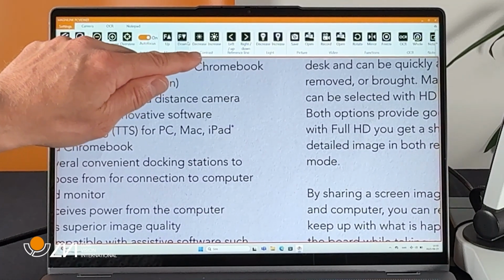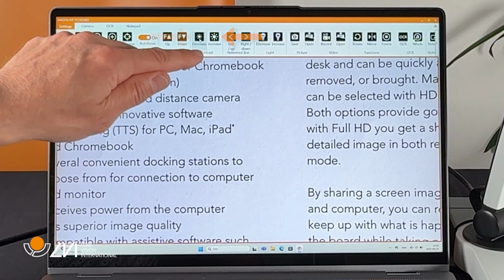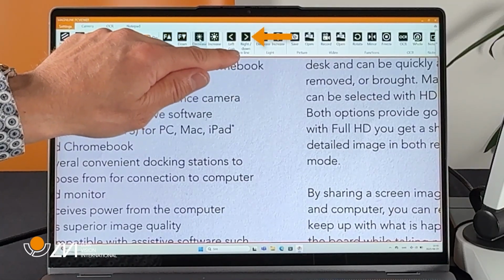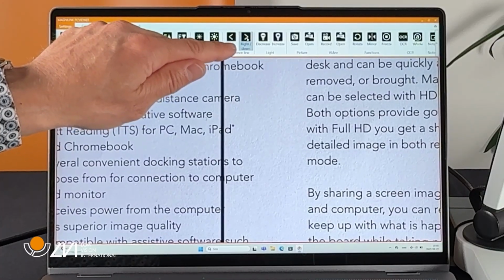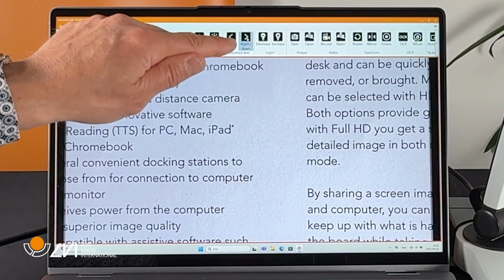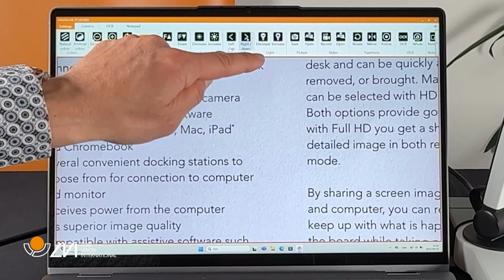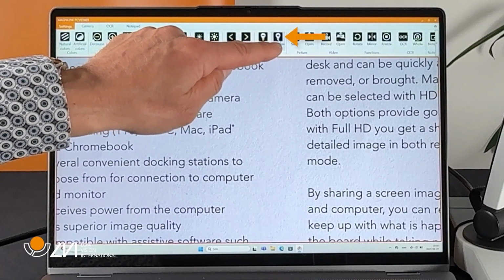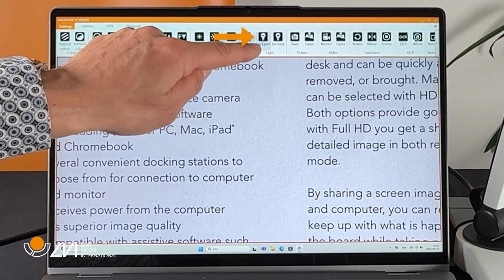The next ones are contrast buttons. Use them to increase or decrease contrast. These arrow buttons are used for reference line and curtains. Press to toggle between the different modes. The next two buttons with a light bulb control the light of the unit. Press them to increase or decrease the light of the unit.